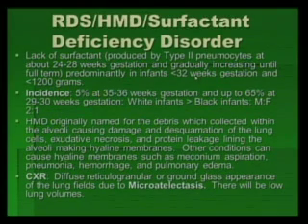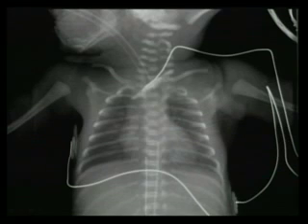They give them surfactant, and that's to keep the alveoli that are open open, and whenever the new ones open, to keep them open too. They give them high positive end expiratory pressure. They put them on CPAP, and that's to try to open up the collapsed ones. But initially, the granular lung pattern is due to microatelectasis. Then later on, they're going to get pulmonary edema.